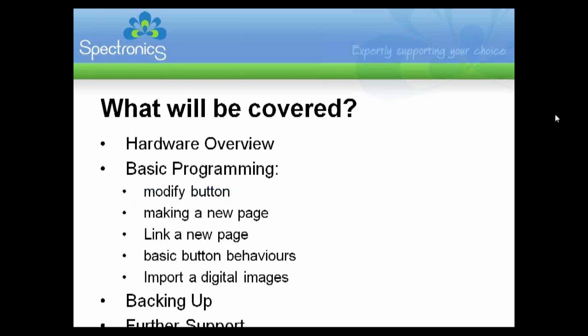So in the webinar, we're going to be covering things like a hardware overview. With the Series 5 software, you can actually access that software on the DynaVox V+, the DynaVox VMAX Plus, and also the Maestro. When we look at the hardware overview, we'll look at the V Plus and VMAX Plus.